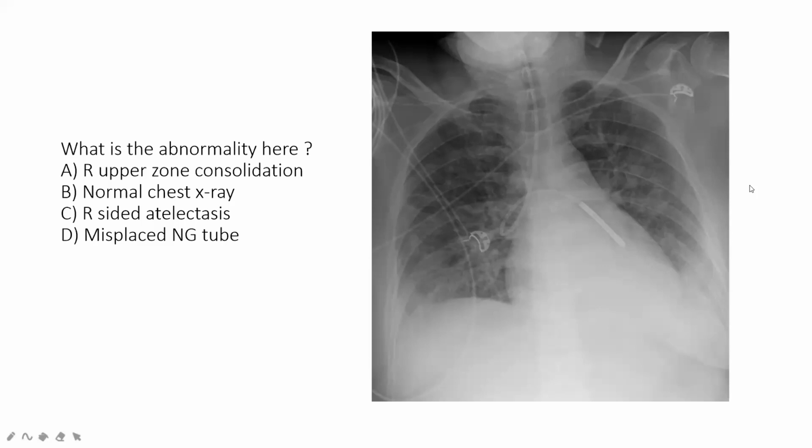Not this case, I mean, but by that I mean you will be asked to assess the position of NG tubes very regularly. And if you say, oh, this is fine to start feeding for this patient, this would be a never event. So we need to be very careful about these.